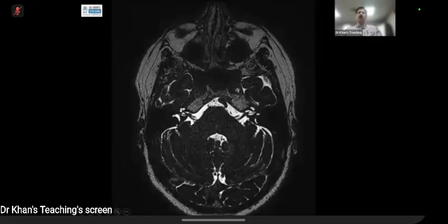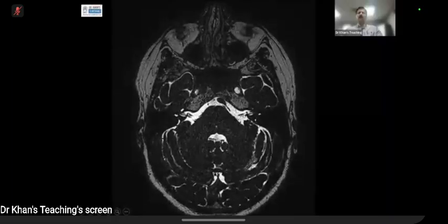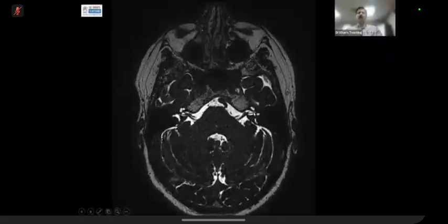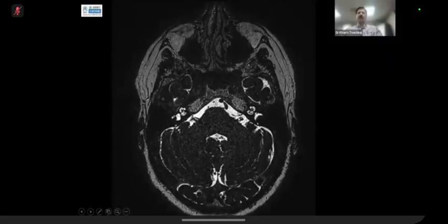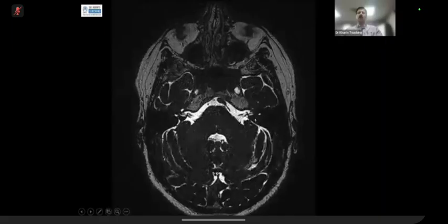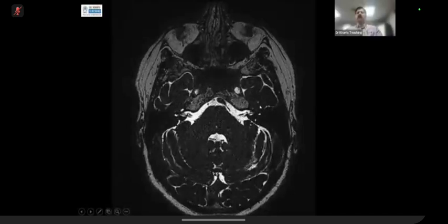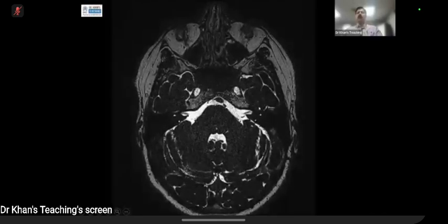Let's go to our friend, the facial nerve. And you can see there is a thinner nerve than this one here. And this thing goes. And you can see that the cochlea, this is the cochlea, it is going superior. So the cochlea is no more visible, which makes sense. And then you lose it. And you can see on a CT scan, it is still visible, but on an MR, you don't see it. This is a CISS sequence.